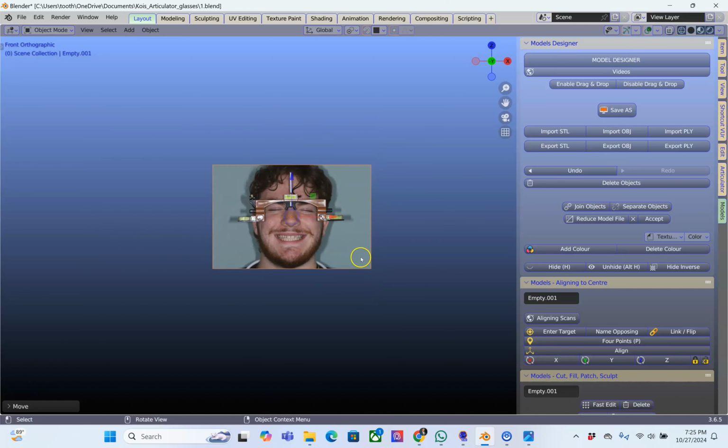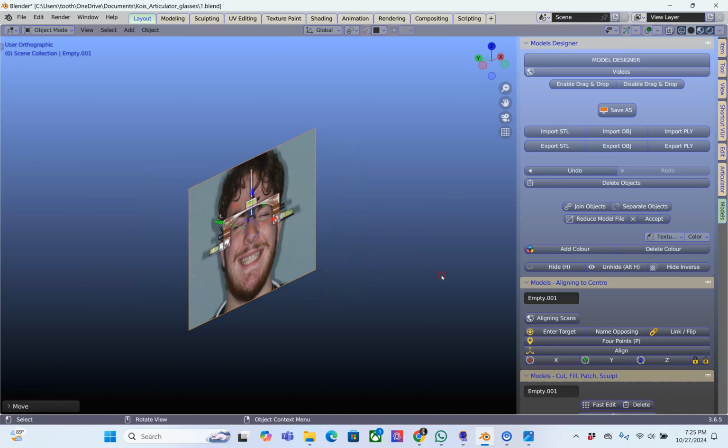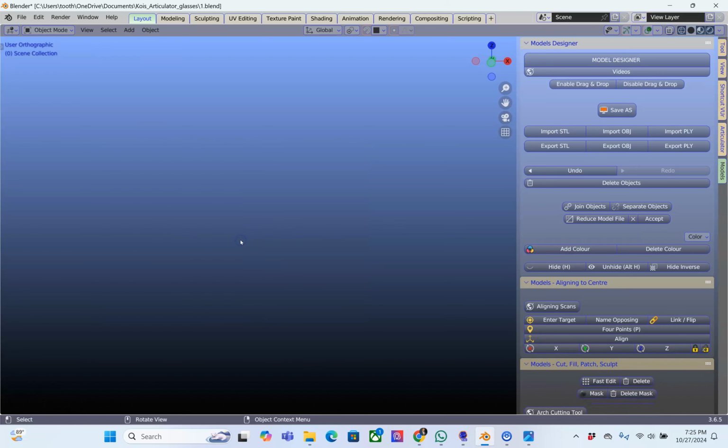This is actually what we call an empty. So if I go Tab, there's no object to it. Tab, we can't edit this. So please note that I'm going to cut out the lips here, so I'm going to go X, delete. Okay. I'm going to look for this photo.